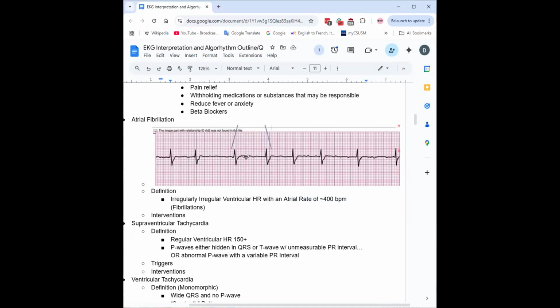You'd be able to tell based on the fibrillations, but we can also see here that it's not really matching the R to R. And there is something with AFib that you need to watch out for, in that interventions to use diltiazem, correct? So let me see if I can get you a better EKG scan.